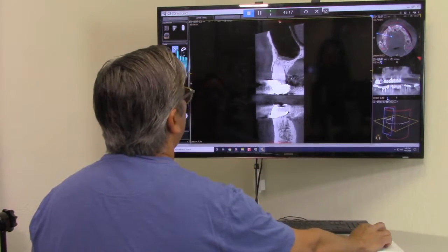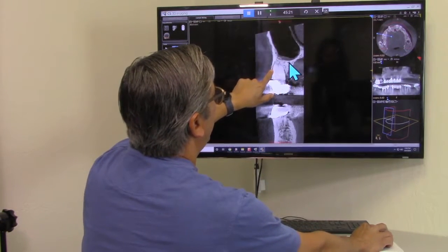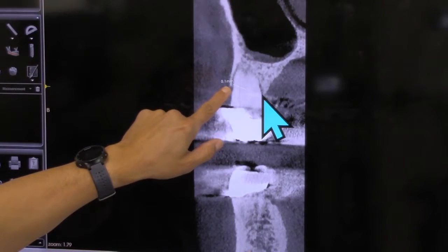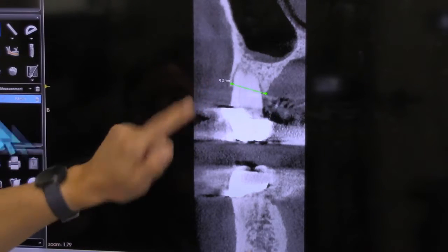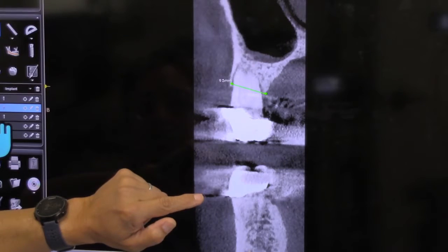So when we take this tooth out, there's going to be a void. Most of the area here, from the bone here, the tooth here, you have bone here to here. And so you want to maintain this structure, so when you put an implant in, you have enough to do. So let's take a look at that. Let me see if I can find that implant.